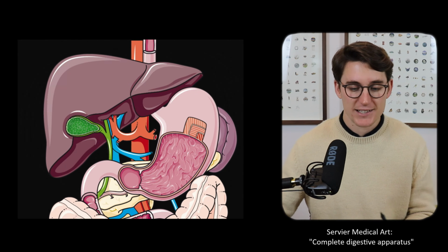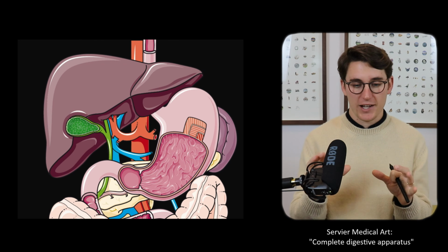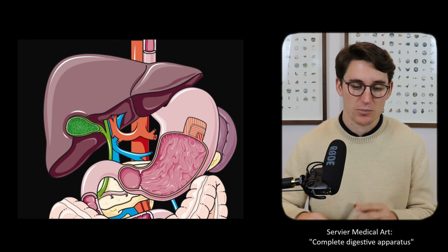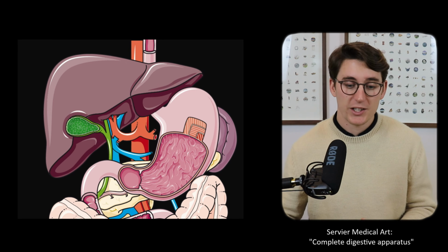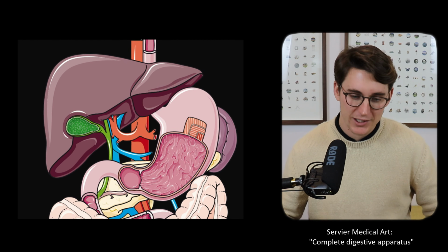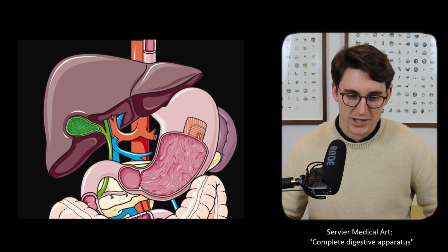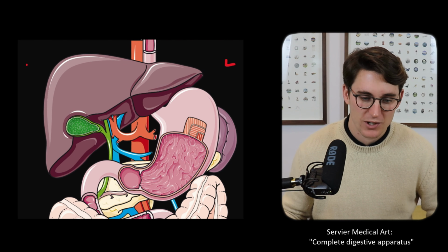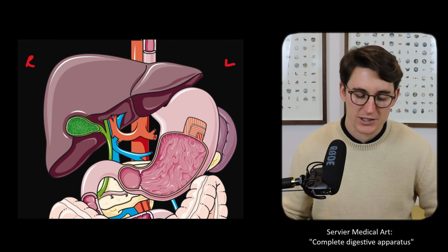So as I've said, let's have a look at an overlaid image with our internal abdominal organs and then see where these branches take us. So here we can see the abdominal aorta coming into the abdomen, our esophagus just there to the left of it. Our patient's left is here and the patient's right is here. We can see our liver on this side.